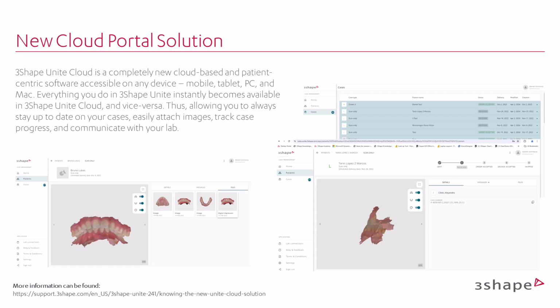The new cloud portal solution, Unite Cloud, is a completely new cloud-based, patient-centric software accessible on any device: mobile, tablet, PC, and Mac. Everything you do within Unite instantly becomes available in the new Unite Cloud portal and vice versa, allowing you to always stay up to date on your cases. You can easily attach images, treat cases, track case progress, and communicate with labs.